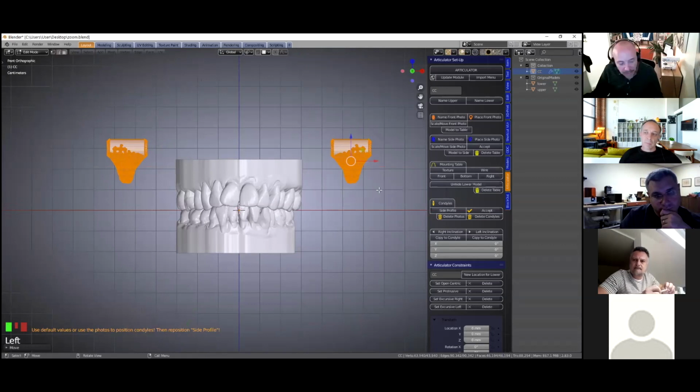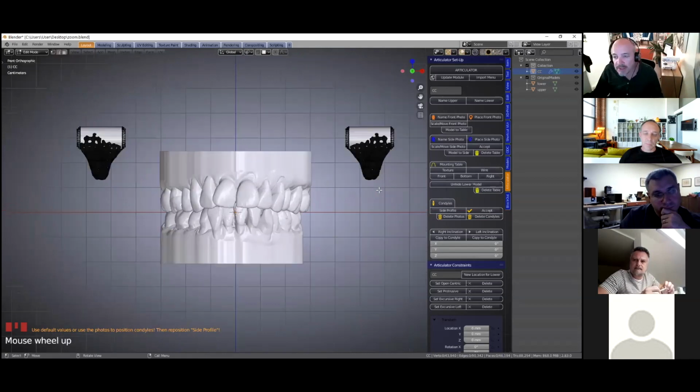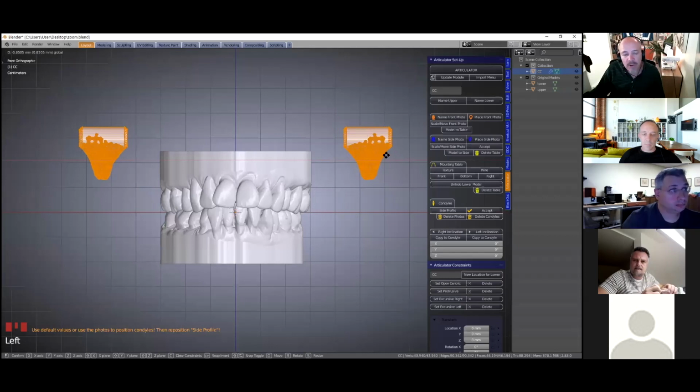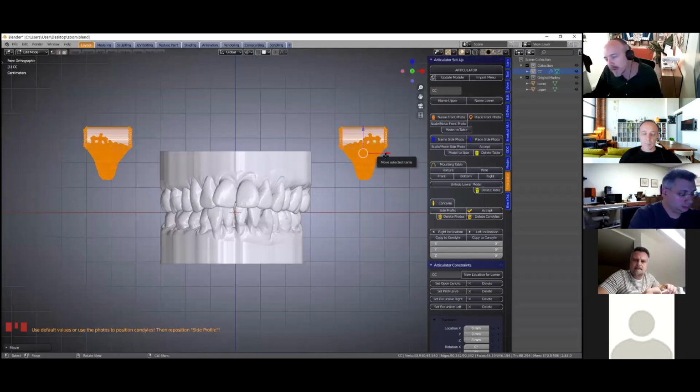If you lose this, just click A to select it again. It is a mirror image, so what we do on the right side, we do on the left. In the next update we will switch everything to the left side, because orthodontists love working on the other side.